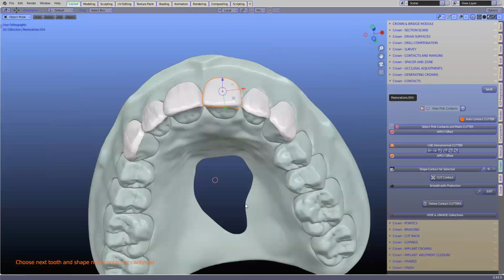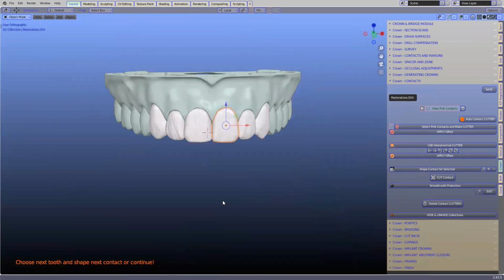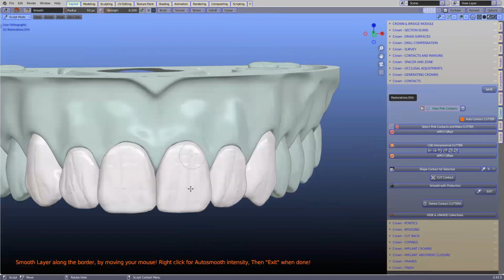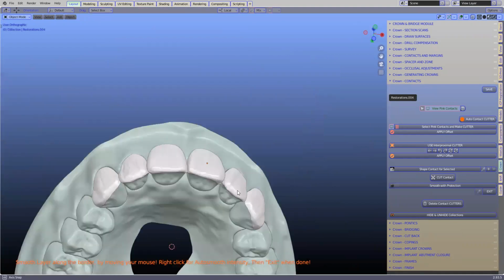Very, very cool. So how would you export these now, Michael? Of course, now you can smooth them down a little bit. You can do quite a lot of things. I mean, this tooth library is a little bit rough here. I can smooth it down a little bit like that. Can you cut the veneer back to make space for layering if we wanted to?